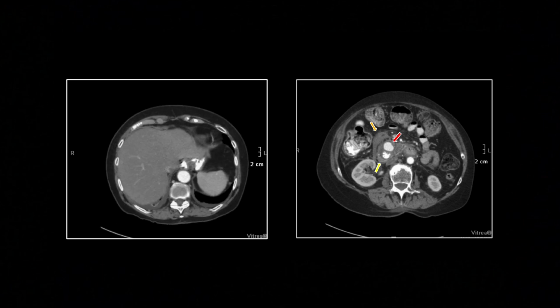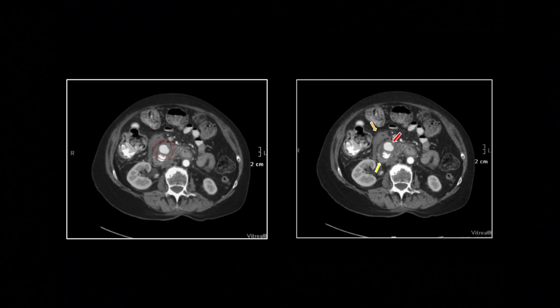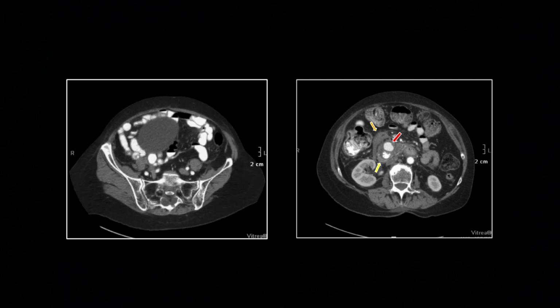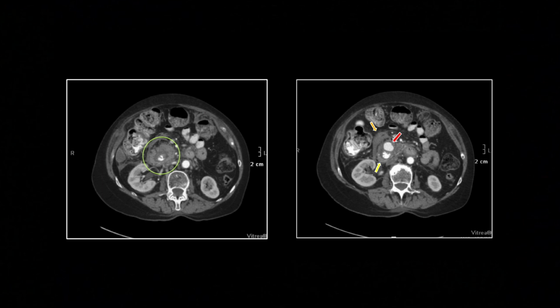So this one is a pretty extreme example. Again, adults are not always symptomatic from these. In fact, I consider this to be pretty unusual. But that is a thick band of pancreatic tissue surrounding this duodenum, and you usually won't see it that substantive. Usually it's just a thin wisp, and it's not even always completely circumferential.